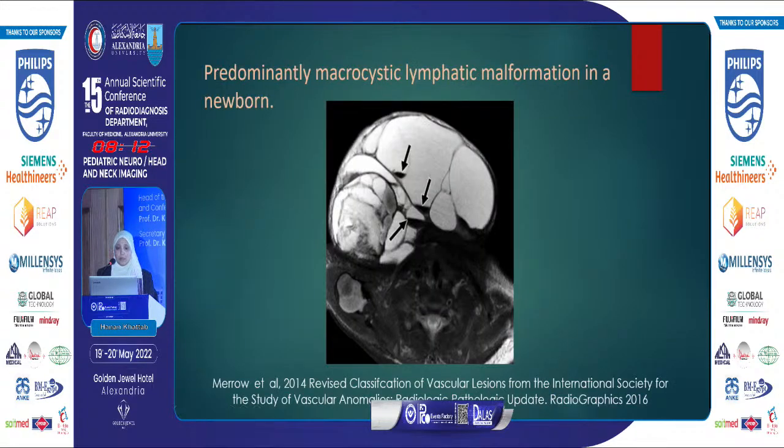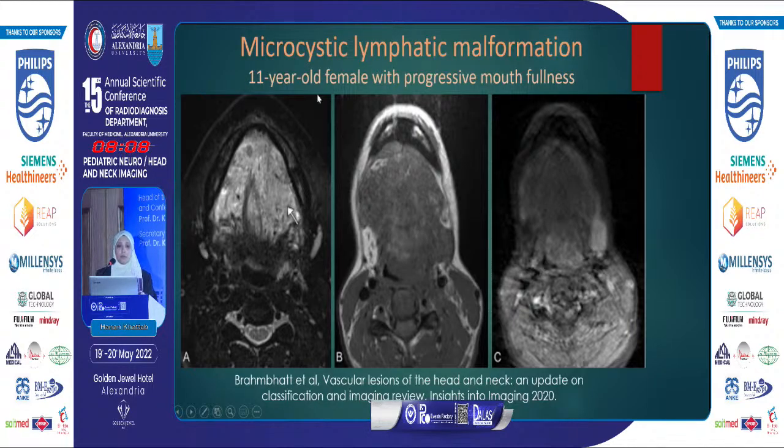This is another example with multiple fluid levels. This is an example of microcystic lymphatic malformation at the floor of the mouth. It appears as a hyperintense multispatial lesion. After contrast administration, there is no appreciable post-contrast enhancement.